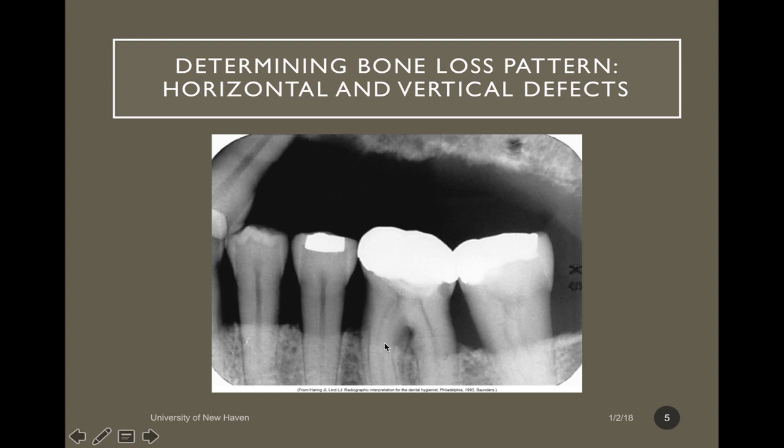When I look at all these teeth, I'm also going to be looking at the big picture here. So I also want you to look at, do you see this dark area between the roots here? We have some furcation involvement here on tooth number 19. I also can see what looks like some radiolucency underneath this crown. So maybe we have some recurrent caries here as well.